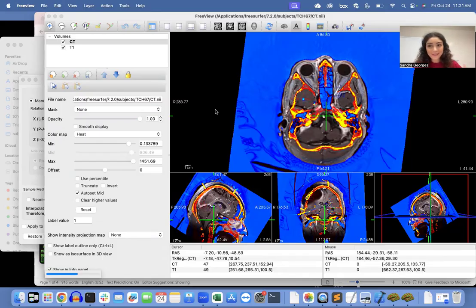So this step can definitely range in time. Sometimes it's really easy and everything aligns anatomically really well within a few minutes, and sometimes it takes a little bit longer if it looks a little bit off or you need to redo the MRI, and it just definitely varies. So far so good though. This is all we're going to need to do in Freeview. So after we make sure this is perfect, we will save it and then run some code, and that will be the end of the first part.